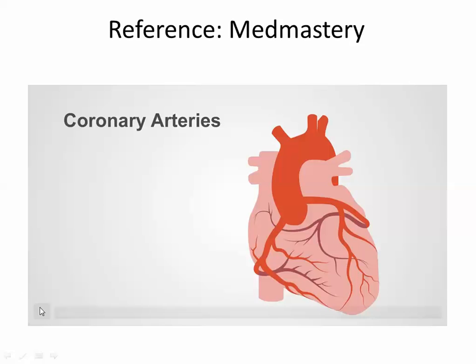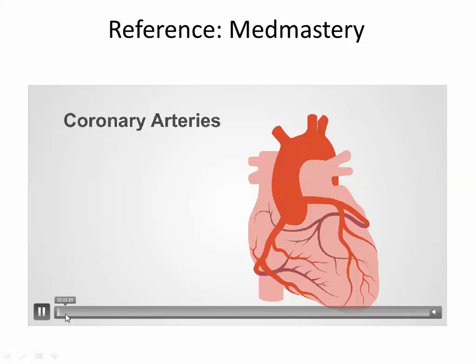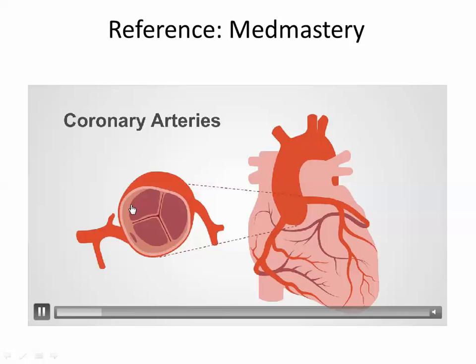This is the coronary arteries, as we said. This is the aorta. This is the LCX going into the AV groove. And this is the interventricular groove. This is an AP view. Going in the interventricular groove is the LAD, giving diagonals, diagonal and septal perforators, and going to communicate with the PDA. This is the RCA giving the acute marginal, and then going to the PDA and PL to communicate with the LCX.